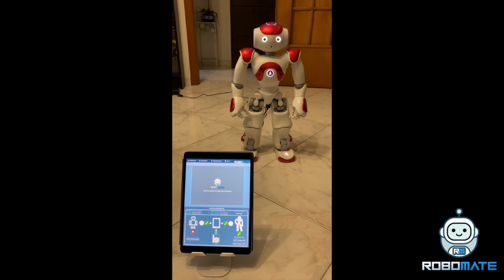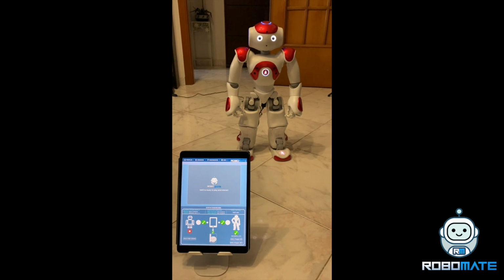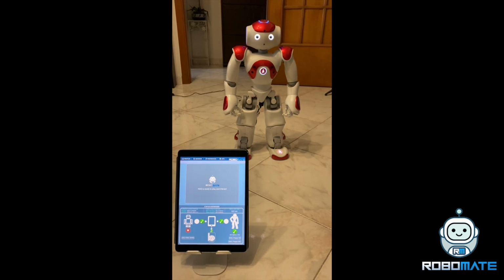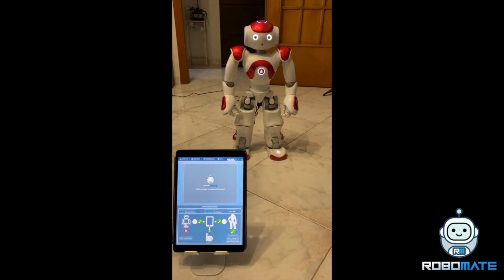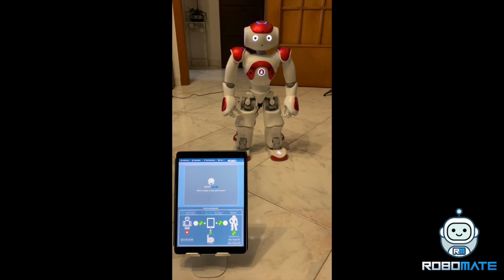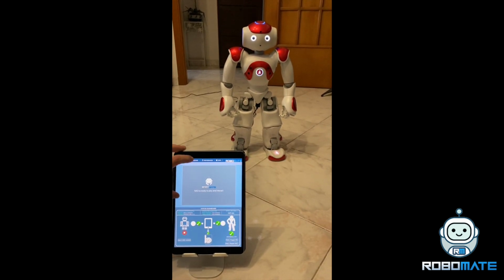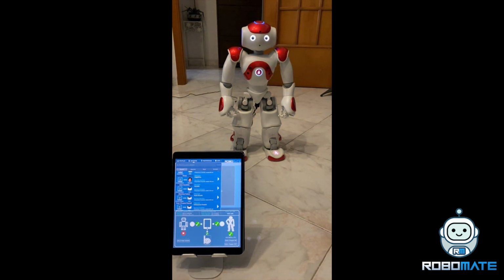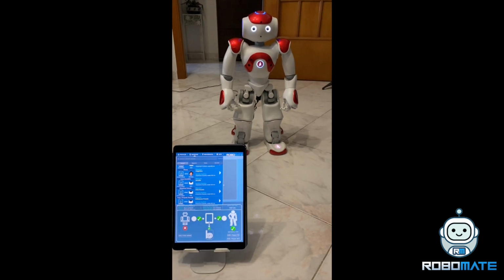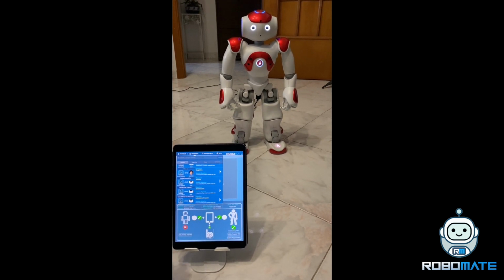roboMate is a software platform that delivers robot-assisted therapy functionality through the NAO or Pepper robot or the Milo R25 RoboKind soft robot. It gives therapists and educators the ability to start, execute, and manage robot-assisted therapy during their therapy activity with children and patients. The software lets you start a session of exercises based on which robot you want to engage during the therapy, and execute applications and exercises directly that work both on the robot and on the tablet.